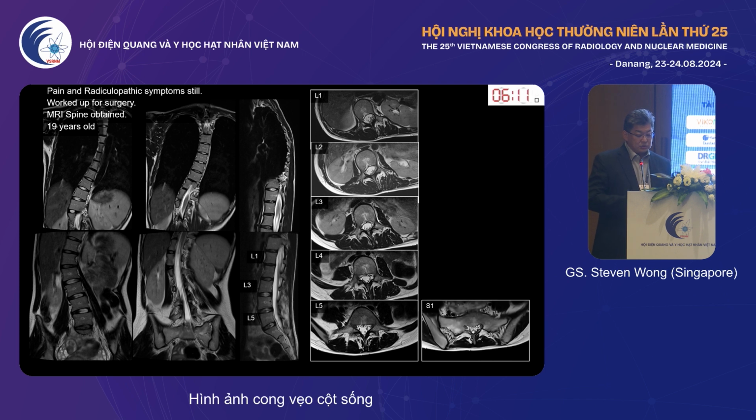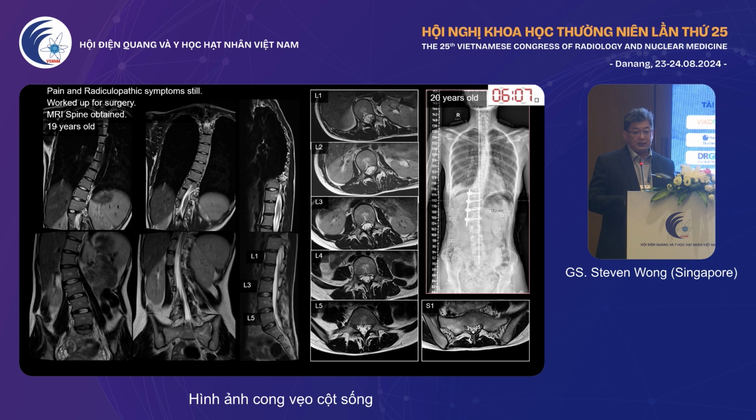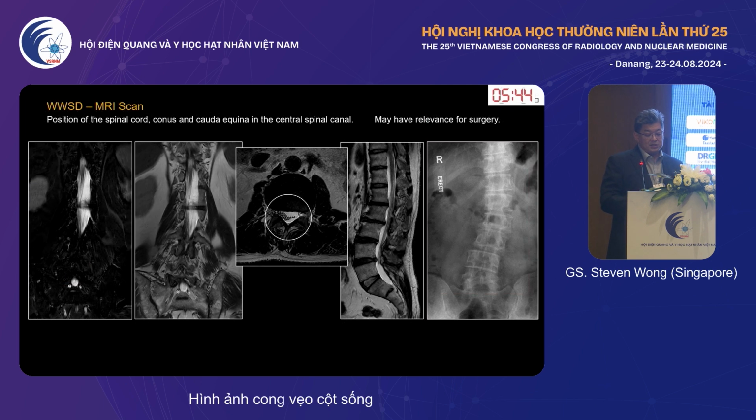So you unfortunately will need to do an MR or CT and then assess the degree of rotation and also the alteration in the angle of the vertebral body in the coronal plane, because that will affect how big the neural foramen is on the concave side versus the convex side, and whether there are any disc problems at that level. So this patient eventually had spinal stabilization.